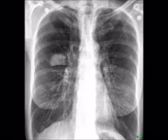4. Look at the big picture. When you're examining a patient, you observe the whole patient from the end of the bed before delving into small details, and it's the same with examining a piece of imaging. Look at the whole thing. Can you immediately see any obvious abnormalities, like a large lung mass?